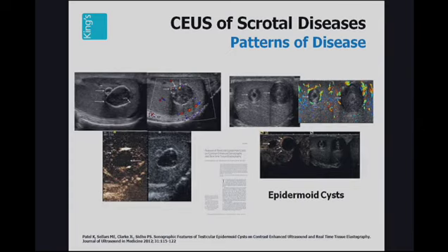Compare the example I've just shown you to the example of an atypical epidermoid cyst, where there is calcification of the rim and no vascularity within the central aspect. This too is an epidermoid cyst. The complete absence of vascularity within this lesion allowed for a targeted excision biopsy of the lesion rather than subjecting the patient to a total orchidectomy.